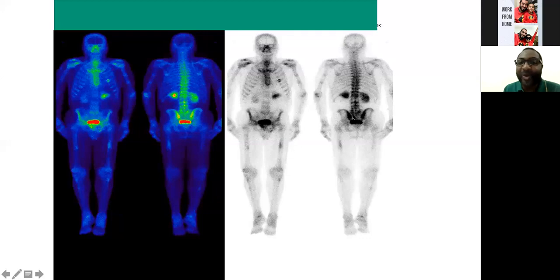you will be worried. So always, like I said, always critically look at your history, because the only reason why you are reporting a bone scan is you are working on specificity, because the sensitivity is very high. Anything can show us increased uptake: degenerative process, infection, trauma. All right. But if you look at your history, you look at the pattern, you do additional images, then you'll be able to absolutely say whether this is degenerative process or this is malignant.